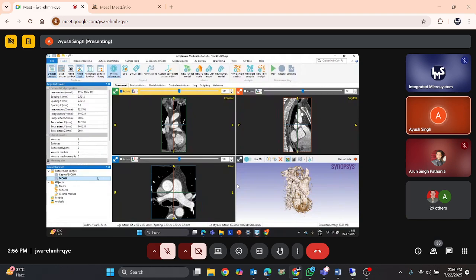Now, if we are making changes in this particular copy and we need to keep the original as it is to check for the accuracy later on, we can do that. We can work on the copy of the DICOM dataset. And one more thing that you might see changing is that earlier the dataset memory size required was 26 MB and now it is 52 MB. So it has doubled. It was 26.04 and now it has doubled to 52.08 MB.